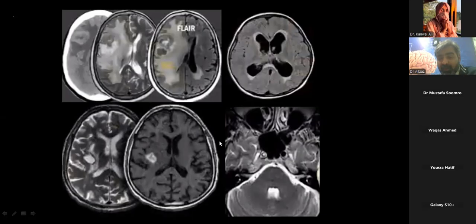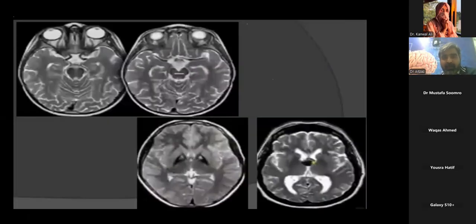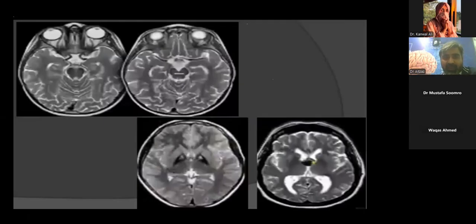and a lot of pathologies. So again, on this T2 weighted image, the edema and the lesion on the frontal lobe are most likely hyperintense on T2 as well as FLAIR, on both sequences. So what is hypointense on T2?